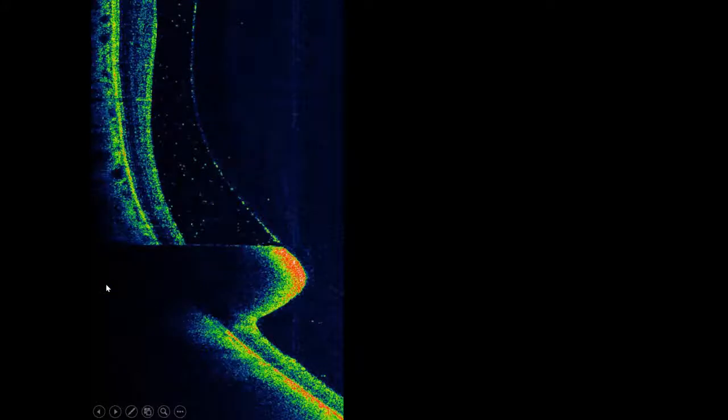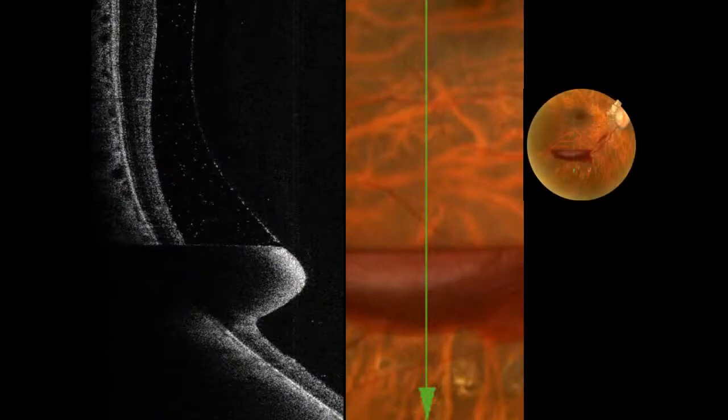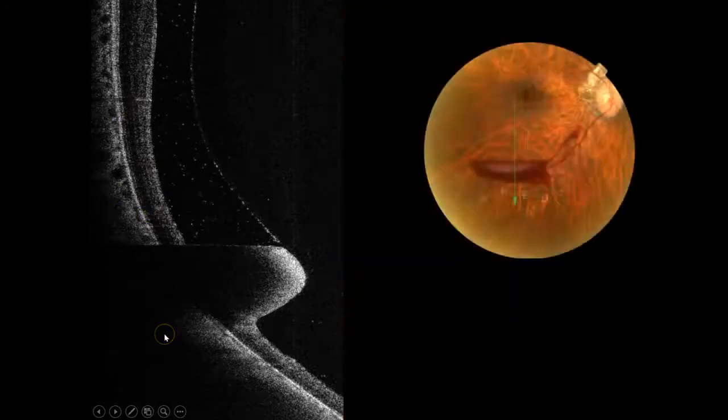Here's an interesting one. Can you visualize what this is going to look like in color? Well, that's what it looks like on ophthalmoscopy. So here's a vertical slice and a vertical slice. And what this is, is subhyaloid hemorrhage. These are actually red blood cells. And these red blood cells, these little tiny dots, are, in a sense, settling into this zone over here. So you may think, what does a pre-retinal or subhyaloid hemorrhage look like on OCT? And here's a perfect example of it.